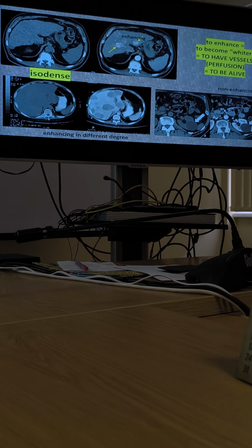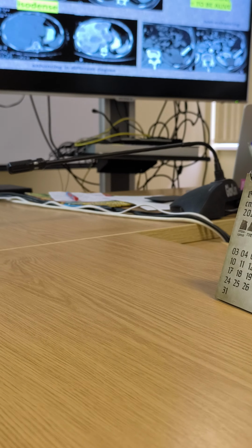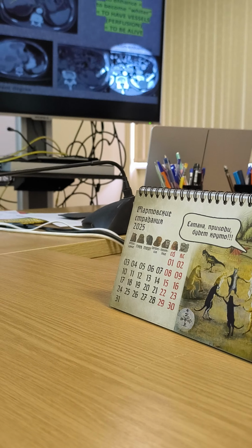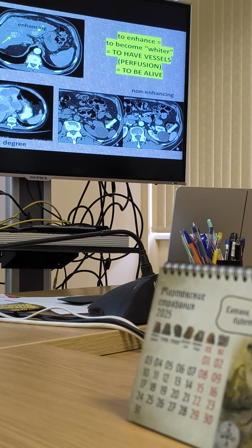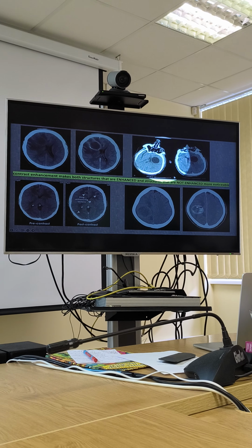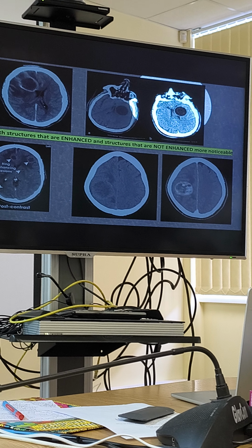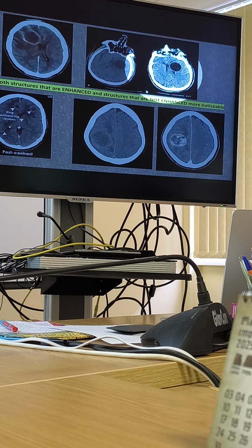So the first sign to keep in mind to understand that this is a contrast enhanced picture, yeah, is to look at the vessels. So this is really good. And in the pelvis, what can help? You can also look for vessels, and for example, vessels look like these white dots, yeah, but they're small vessels, not like the aorta, so they are not so clear.